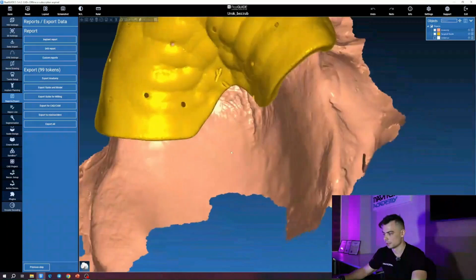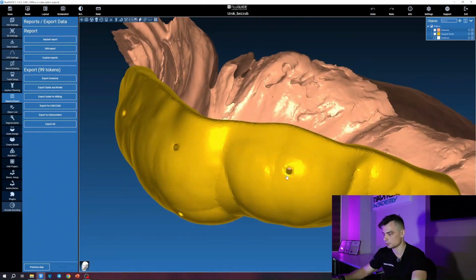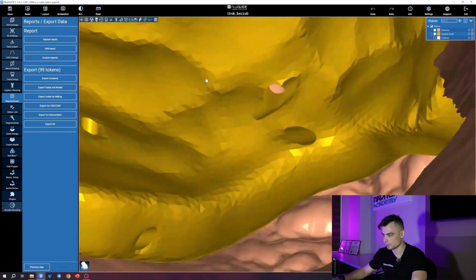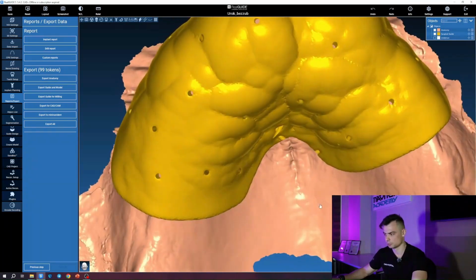Click next step and take a look at the final result. Well, here are the same mistakes I was talking about. When you create this template in this way, by choosing a not so correct path, you end up with these kinds of junk holes, so to speak. And it's really up to you what to do with them.